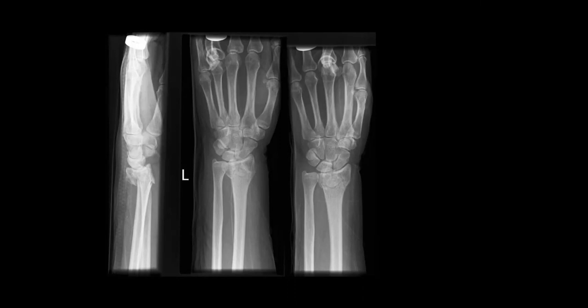As part of S in our ABCS acronym from earlier, we should also note that there is in fact a radio-opaque foreign body, and it's the patient's ring that's seen on the fourth finger of the left hand. Whilst that's not relevant to the pathology, it's good for you to get into the practice of looking at every aspect of the film to make sure that nothing is missed. And it just shows that you've acknowledged it and you're aware that it's there.